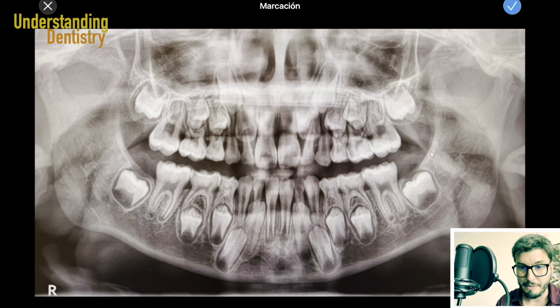On the other side, we have the same. The deciduous molars are here on top of the permanent premolars. The first permanent molar is here, all right? So that's the 3-6, for example, and then the germ of the 3-7 is here, the same for 2-7 and 2-6, all right? Very clear stuff. Okay. We have some superimpositions, there are other aspects of this case, of course, but let's see now something that you guys maybe didn't realize.